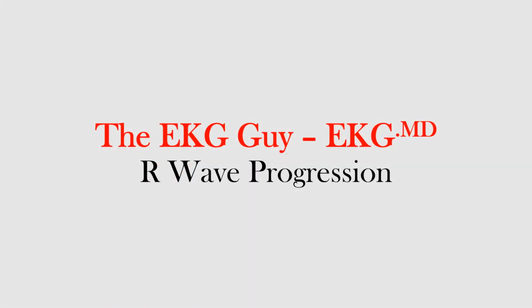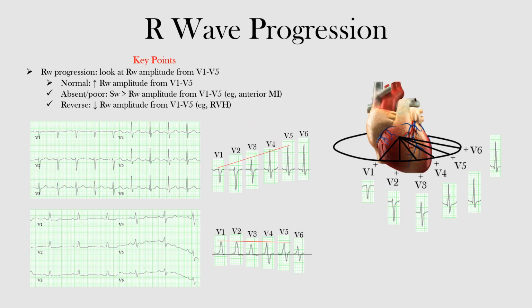In this lecture, we will discuss what R-wave progression is and how to determine if it is normal. The precordial leads, or chest leads, look at the heart in the horizontal plane. V1 gives the most rightward view of the heart, while V6 gives the most leftward view of the standard precordial leads. So if you look here, we have lead V1 sitting here.